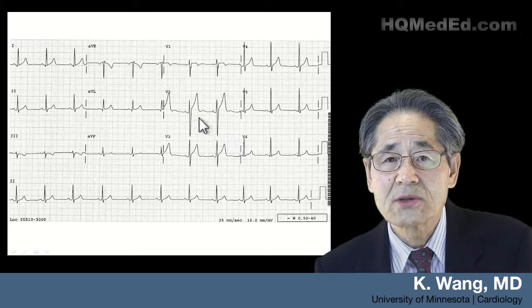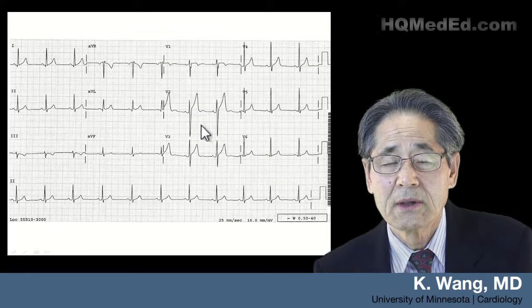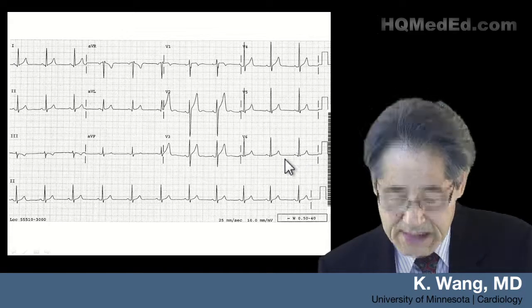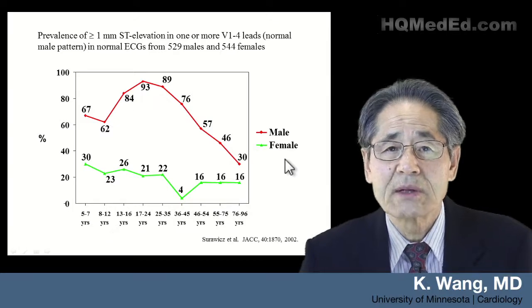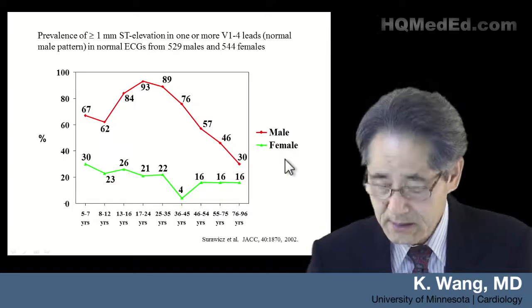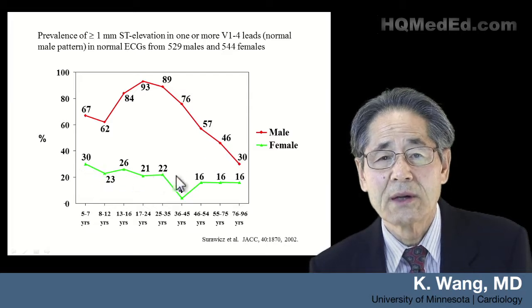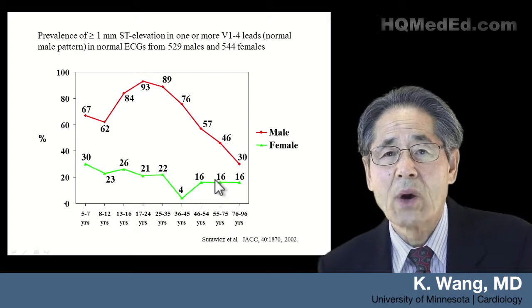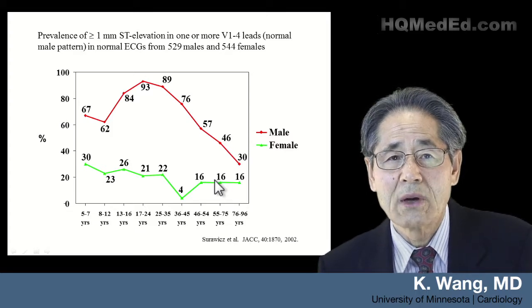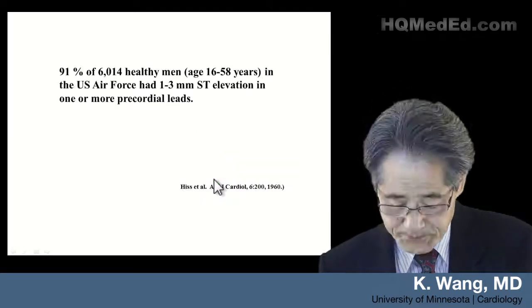Now, this patient has about 3 millimeter ST elevation, but believe it or not, this is a normal ST elevation. Easily 90% of healthy young men and 20% of women throughout their age will have 1 millimeter, 2 millimeter, up to 3 millimeter ST elevation normally.